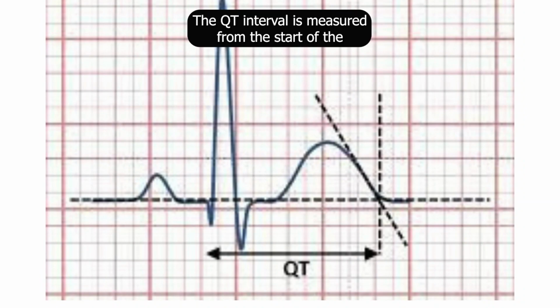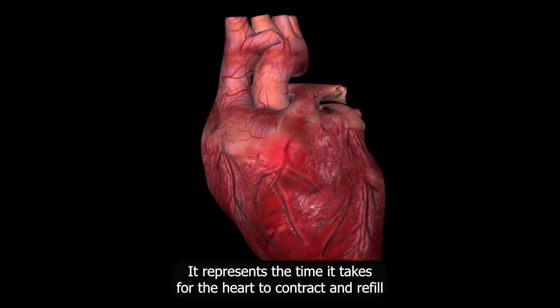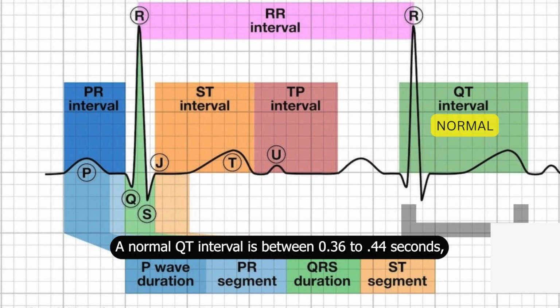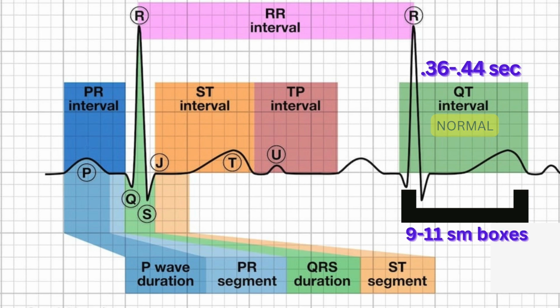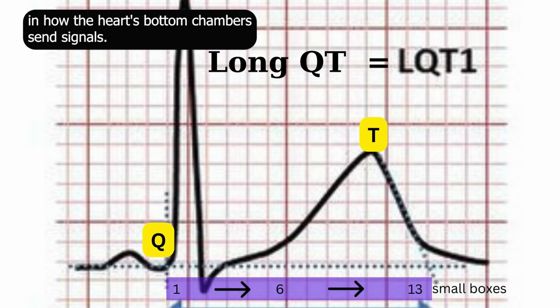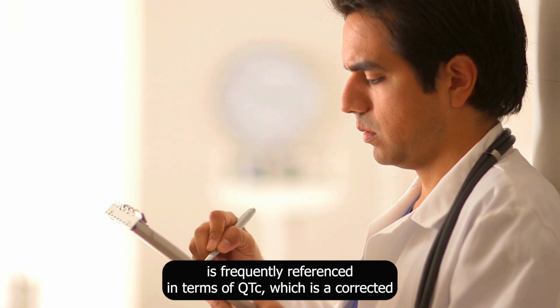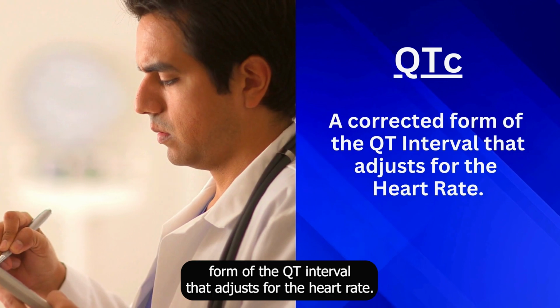The QT interval is measured from the start of the Q wave to the end of the T wave. It represents the time it takes for the heart to contract and refill with blood before it beats again. A normal QT interval is between 0.36 and 0.44 seconds, or 9 to 11 boxes, as seen here. A prolonged QT interval is an irregular heart rhythm and reflects a disturbance in how the heart's bottom chambers send signals. It should be noted that the QT interval is frequently referenced in terms of QTc, which is a corrected form of the QT interval that adjusts for the heart rate.